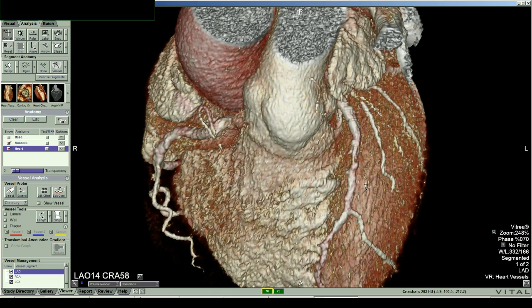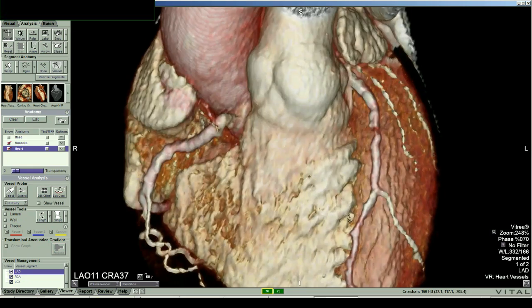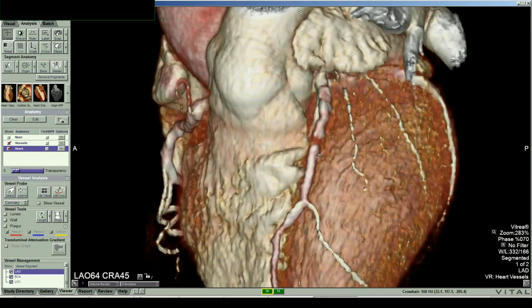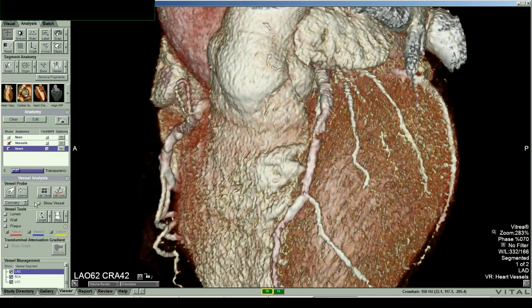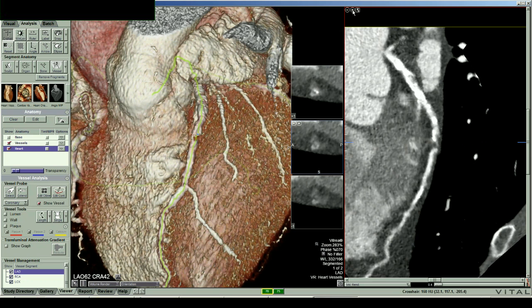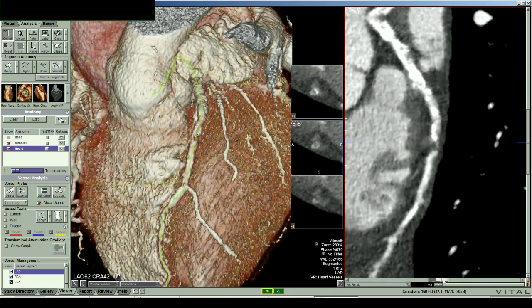And you see it looks a little bit different now. It used to be that there was this calcium coming around the side, and then right here was a connection, so that's where the blood flowed through, and we don't see that connection anymore. So it looks like it's actually thrombosed, and what we're seeing is a piece of calcium that's sort of spanning both areas. So let's look inside this and see if that's what it looks like inside. We're going to make this bigger, and we're going to rotate it a little bit.